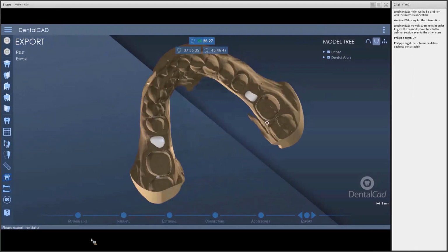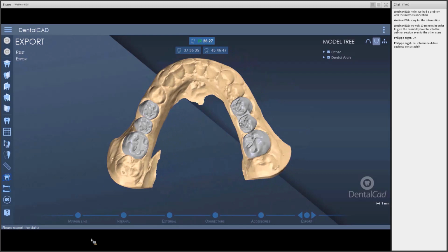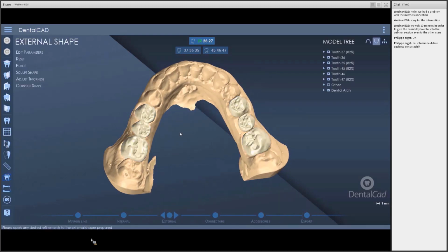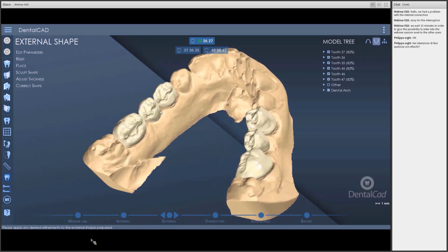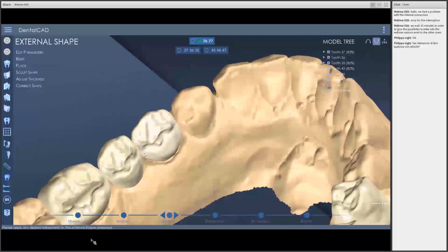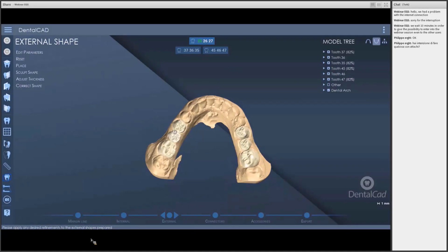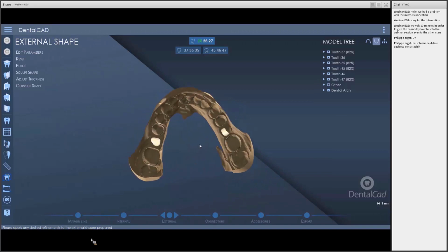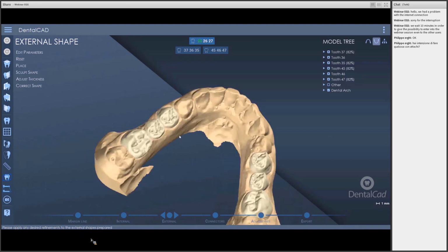This enhancement concerns the mesh brightness. Basically, we have the possibility to change some parameters in order to manage, as I told you, the mesh brightness. So this is the previous situation.